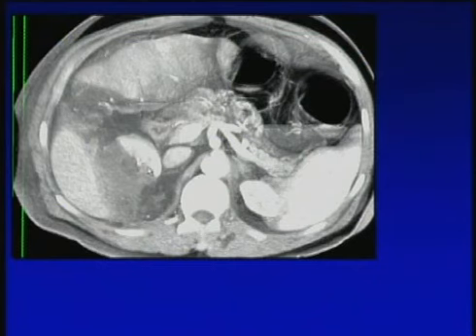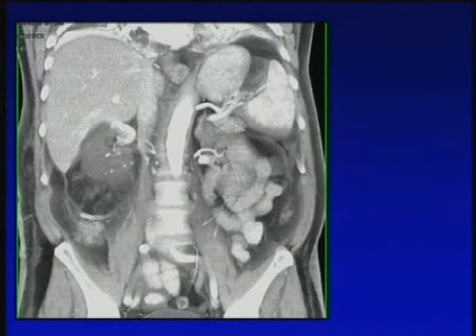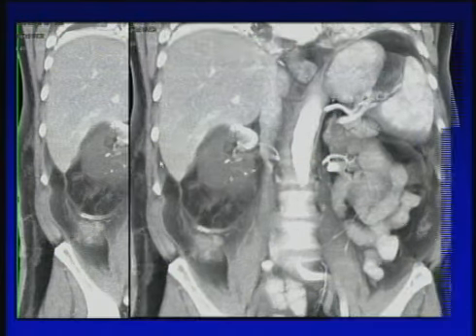You can see some of the changes due to prehilar branching nicely in this case. This patient had a partial nephrectomy that went bad. You can see they infarcted a good portion of the kidney. This portion of the kidney is enhancing because when you start looking carefully, it's fed by a prehilar branch. So you can see the importance of prehilar branching. If the surgeon does not recognize it, early on in the experience with laparoscopic nephrectomies for donors, there were a lot of issues with renal infarction because of small branches that were critical. This is a 2 millimeter branch, yet it's supplying 25% of the blood flow to that patient's kidney.